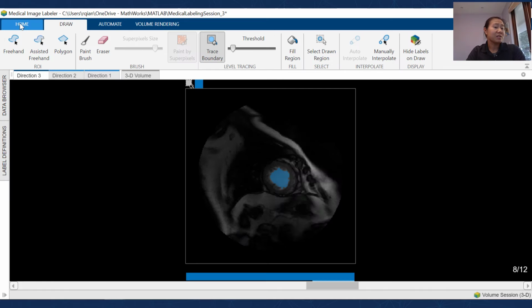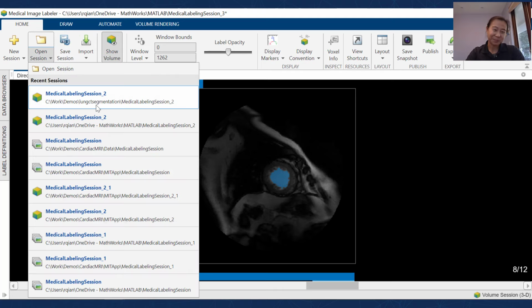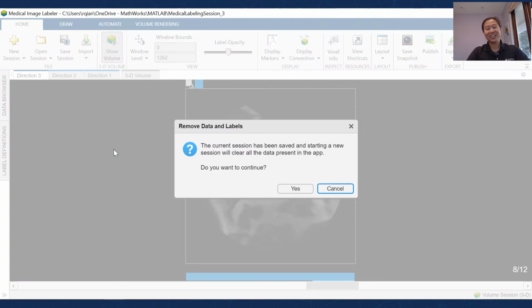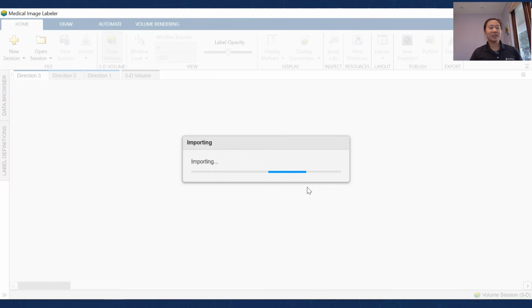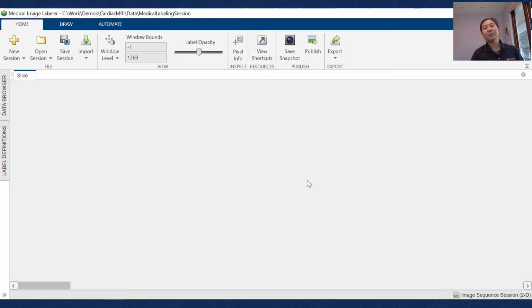So like I mentioned, this data set actually came pre-labeled. So thank goodness I don't need to label all of them myself. And the pre-labeled images, I think I should also mention, are actually not a perfect volume. They've selected specific slices out of the data set.